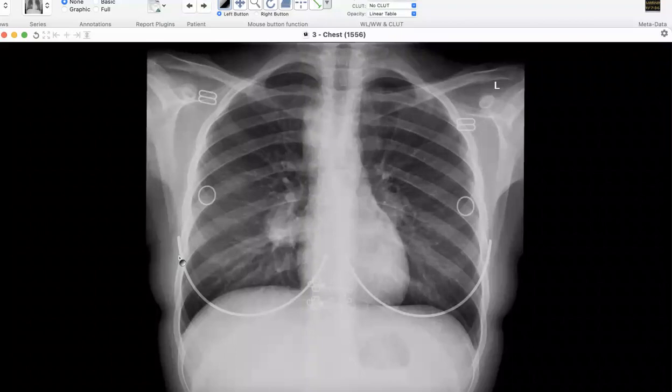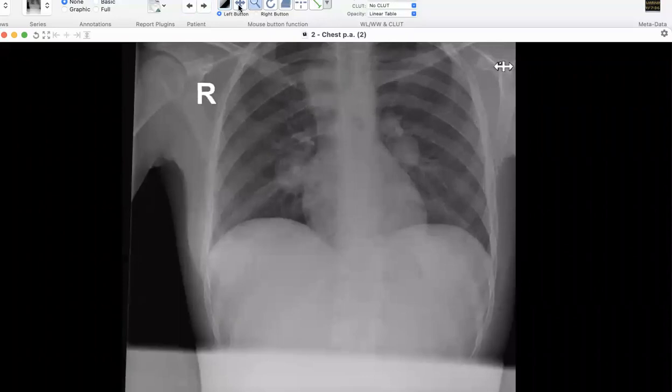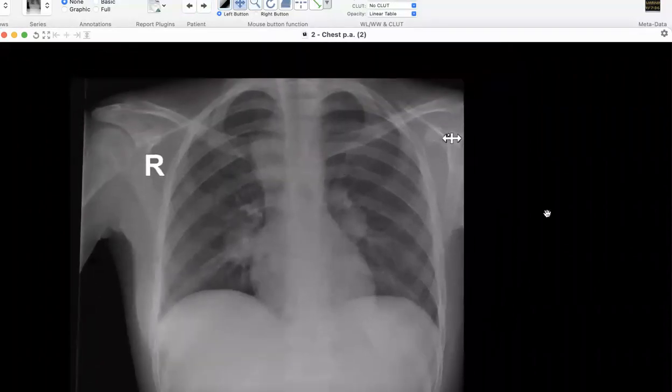Mediastinal lesion, right. Could be bronchogenic cyst. However, this is not in the shape of a cyst, or thymoma, teratoma. These are all other mediastinal lesions. So this patient was followed up a little later. She was treated for infection, and this is about a month later.